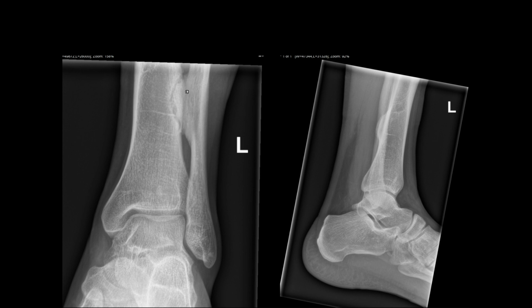Osteochondromas rarely undergo malignant change, in which case there is a change in symptoms or change in the growth of the palpable bony lump. In those cases, MRI is performed to measure the cartilage thickness, and if the cartilage thickness has increased, then the case will be discussed in a multidisciplinary team meeting, and a subsequent CT-guided biopsy is usually undertaken.